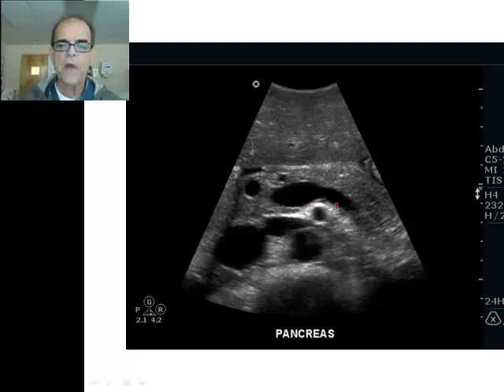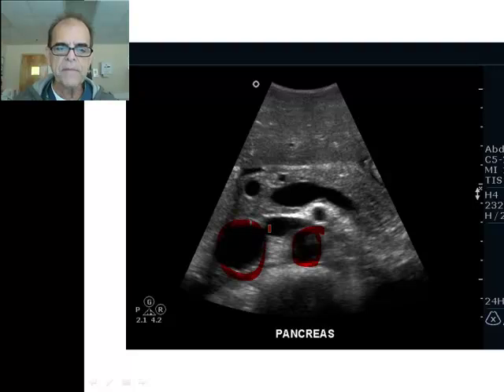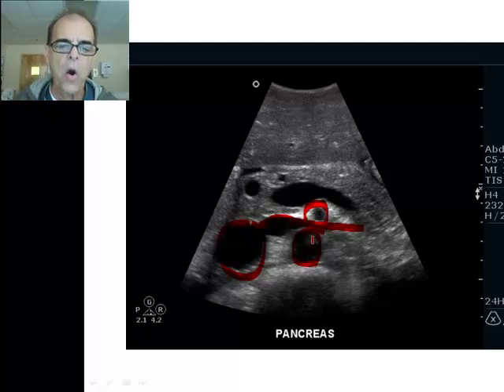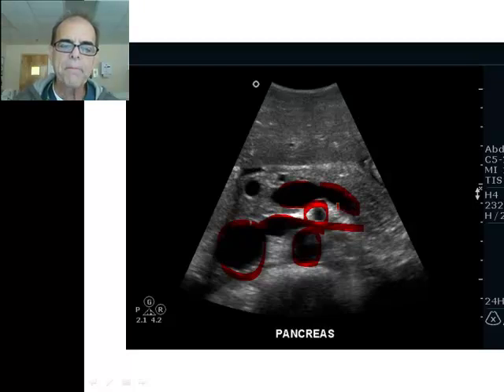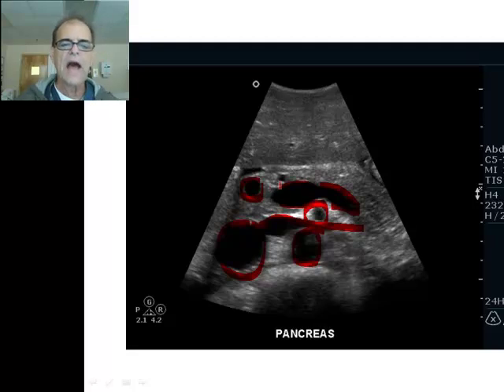And you have here one ultrasound of the pancreas in transverse orientation. This is the aorta, this is the IVC, this is the superior mesenteric artery, this is the left renal vein that courses between the superior mesenteric artery and the aorta. This is the confluence with the splenic vein, and the common bile duct, dilated, because the common bile duct in general is smaller than this. And in this one it is possible to see the gastroduodenal artery.